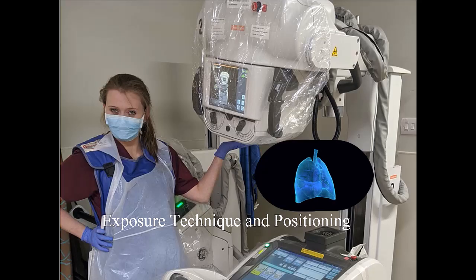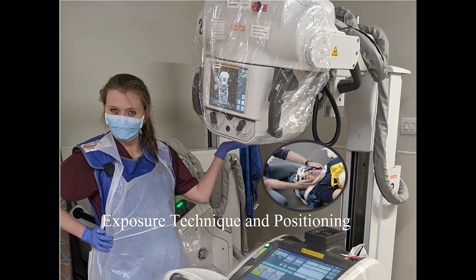Proper technique and positioning for chest x-rays are essential for accurate results. Typically, patients are positioned upright if possible to allow for better visualization of air and fluid levels. Effective positioning and technique lead to clear X-ray images, aiding in accurate medical diagnostic assessments.